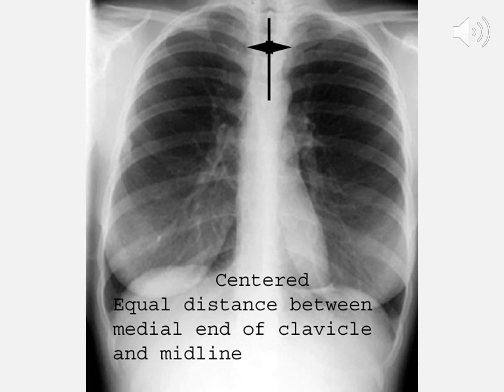So I'm sort of breaking this down into sections, but I want you to get to a point where you can put all of this together. And we're not quite there yet, but when viewing an image, we should be able to tell, is it a PA versus an AP? Is this image centered? Are all of the pieces of a chest X-ray located in this film that are supposed to be in there, i.e. the costophrenic angles, all the lung tissue, the airways, the top to the bottom of the lungs? That is really what we're evaluating. So we should be able to tell if this is centered, if it's an AP or if it's a PA, and then begin to identify some abnormals.